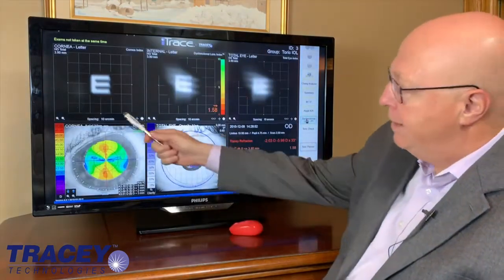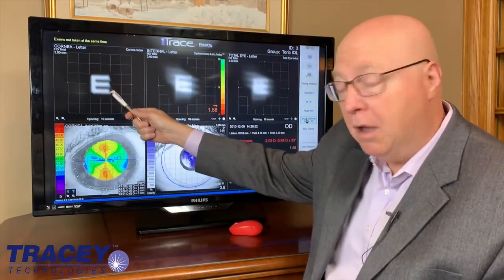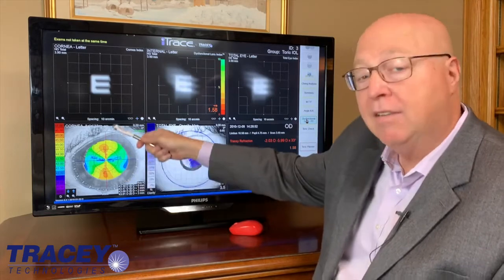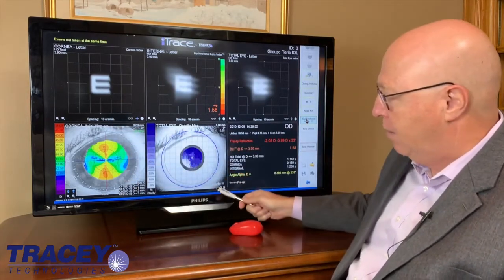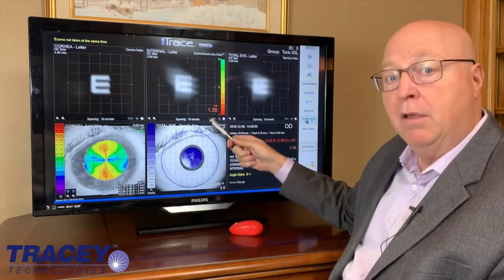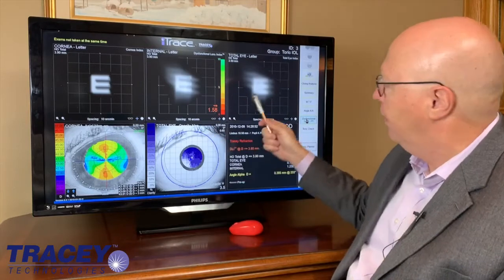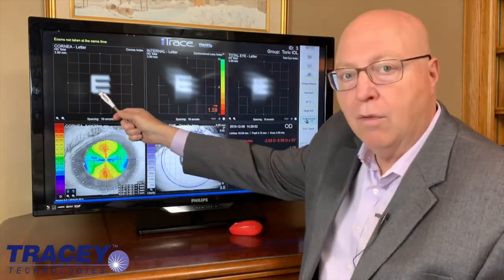When you look at the DLI screen, we have the optics of the cornea, and they're not that good. You see a lot of astigmatism. It seems regular. It seems normal. You do see a big cataract here on the opacity, and you see a correspondingly low DLI. So this is a classic mature cataract. Their vision is bad. It's primarily this, but it's also the cornea.